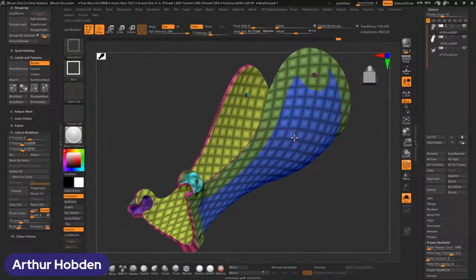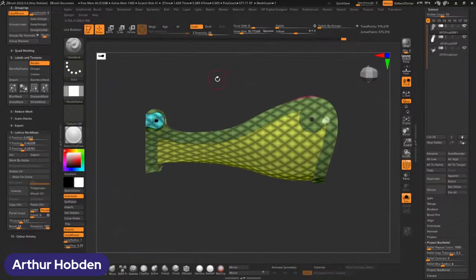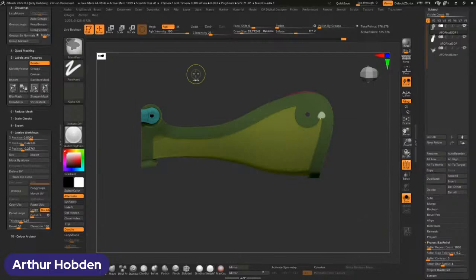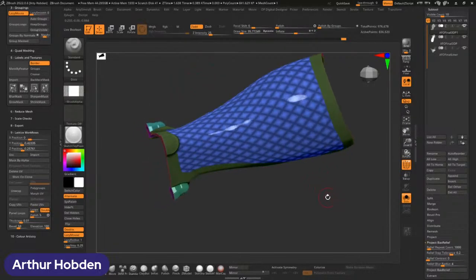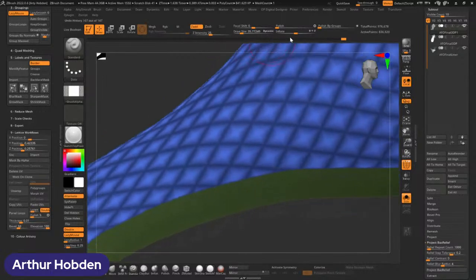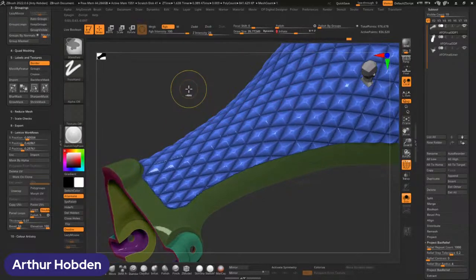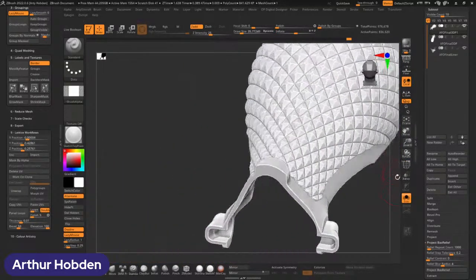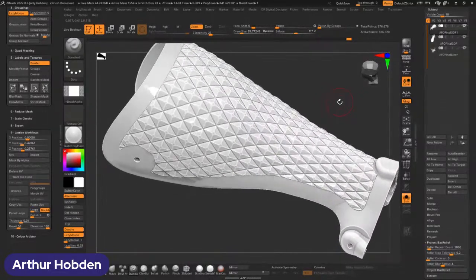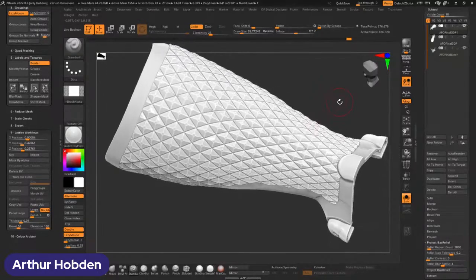We're going to select the group we want to work on, select it again to remove it, and let's just remove all of this altogether. We're just going to completely mask that out, return to that group we want, and there we have it. We only have a mask now applied in this area. So if we decide to do an inflation here, just a very small inflation, we can clear the mask, clear this, take a look at that, and boom, there we have a texture. Nice and easy, and all done from a 2D image.